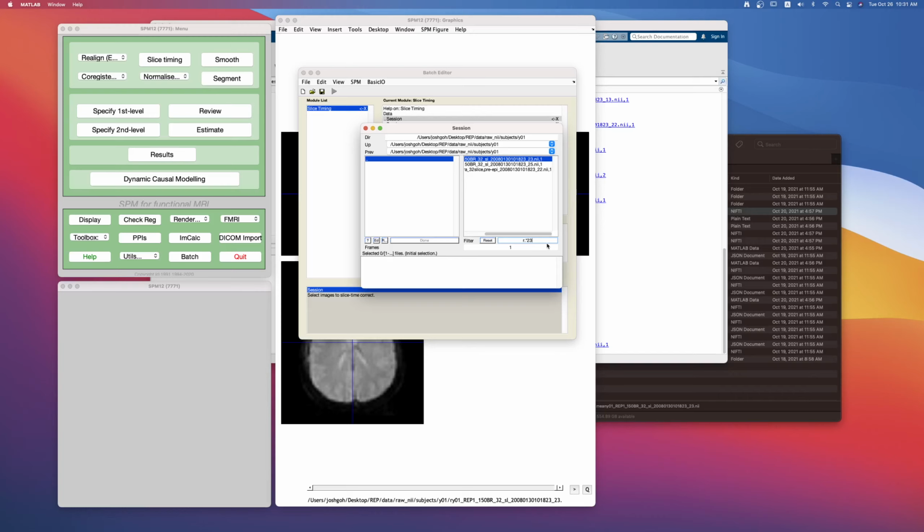Oh, sorry. That doesn't make any difference because all 3 have a 23 there, as you can see. So actually, to make it even more salient, you're just going to put a dash in front because the underscore will highlight this one. So if you hit enter here, there should be only one series highlighted now because there's only one file that has the R in front and also the underscore 23 in its file name. All right, so that's how you use the filtering.